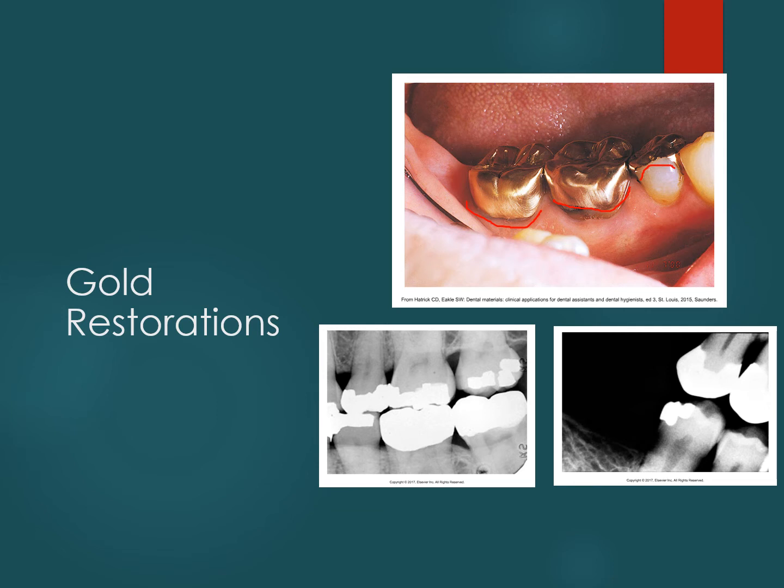But anyway, down here in this radiograph, without 100% being able to see the person's mouth at the same time, and this is not the same person here. These are not the same because this has a mesial aspect and a distal aspect to this onlay, and this does not have a distal aspect. So if they were trying to fool us here, they aren't doing too good a job. But these areas at the top, these are probably amalgam. These ones at the bottom could very well be gold crowns. And this could very well be a gold inlay or onlay, sorry.